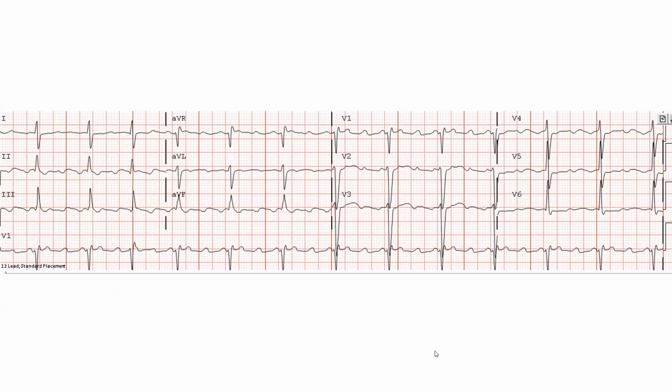This is another EKG. What's the diagnosis on that EKG? So there is atrial flutter, agree. 3-to-1 atrial flutter, unusual atrial flutter. What else? Incomplete what? Right bundle? How come? Why right bundle? In order to call it right bundle, it's not enough to have RSR prime in V1. R prime should be pronounced, should be close in size to the S wave. And the slurred S in V5, V6 should be, by definition, wider than the initial R wave.